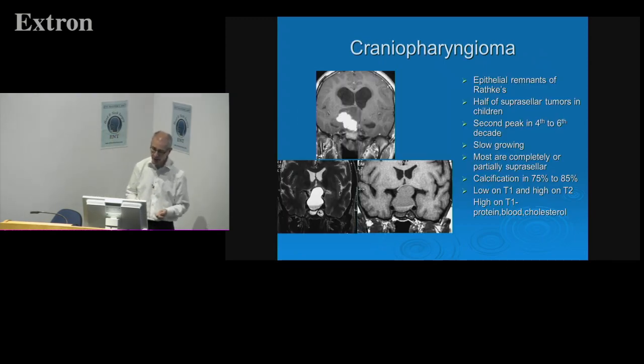Craniopharyngiomas, again, calcification is seen in quite a lot of them, not all of them though. And if you're looking for calcification, I always like to get a CT on these patients when there's any query about it, because you've got a much better chance of picking up the calcification. MR is not that great at calcification.